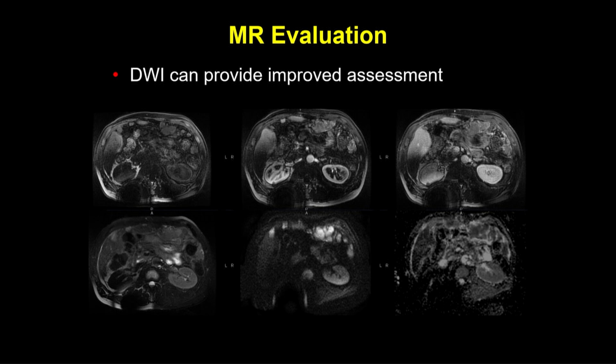One thing that's bailed me out is diffusion-weighted imaging, because sometimes with the bowel there can be motion or artifact, and you don't really get a good sense of what's going on with the peritoneal cavity and adjacent bowel. But here, I think with diffusion, we can see there are some restricting nodular soft tissue masses. When you go back then and look at your other sequences, you can convince yourself that those are real. And sometimes you kind of gloss over the peritoneal cavity.